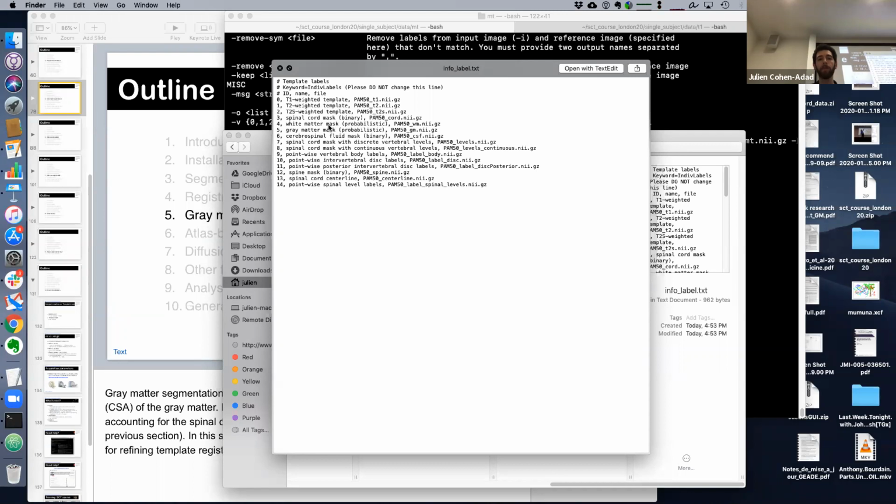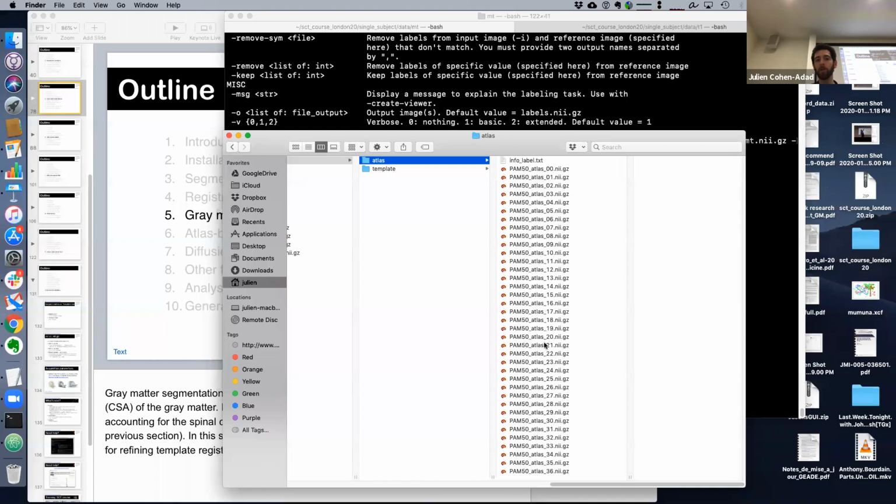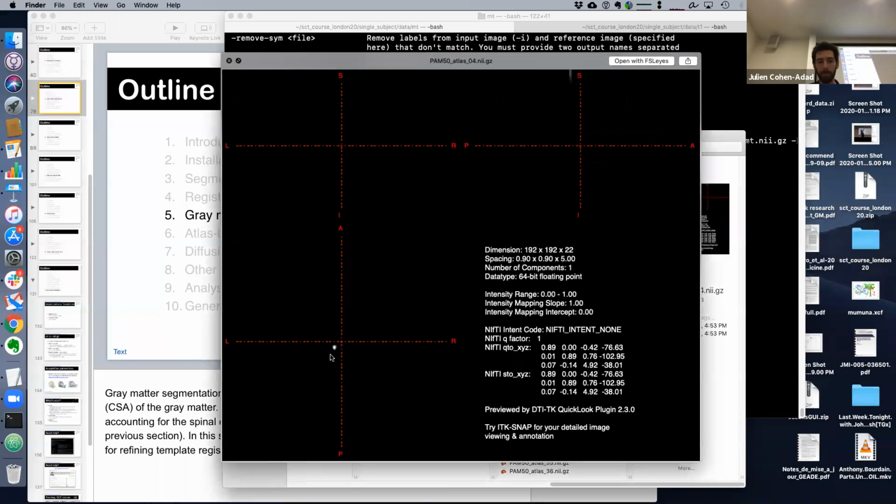And the probabilistic masks of white matter and gray matter are interpolated using linear interpolation. You also have another folder called atlas that has all the different white matter tracts, and these are soft masks. They are coded between 0 and 1, and it has the partial volume information about the tract location. And we use linear interpolation here.